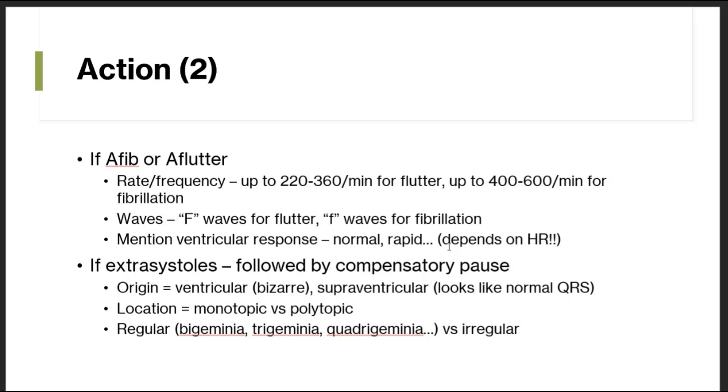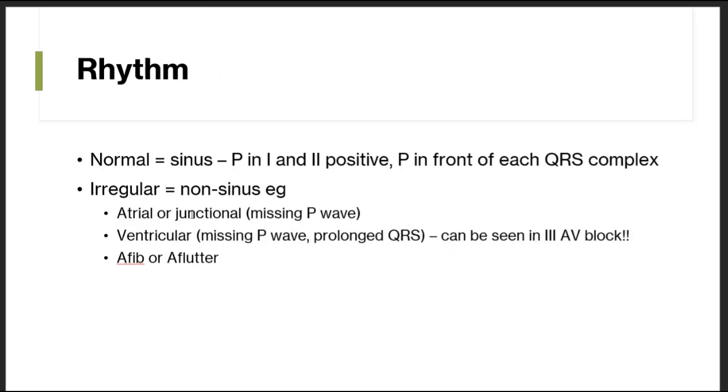And in most cases, it's irregular actually. It's not like bigeminy, trigeminy, or quadrigeminy, but you must know of its existence. Next up, we have the rhythm.